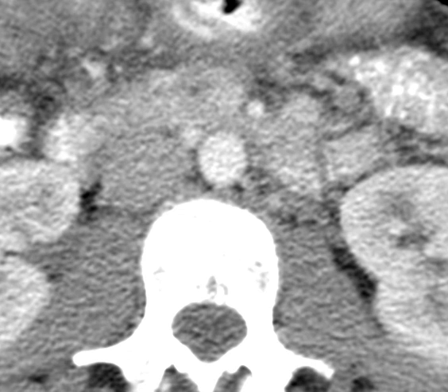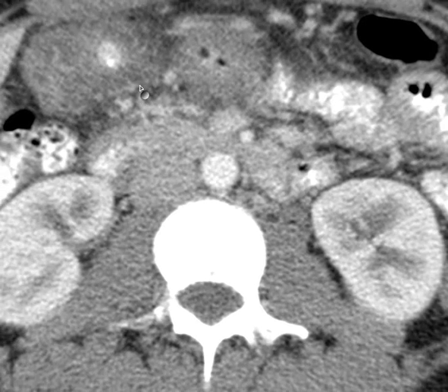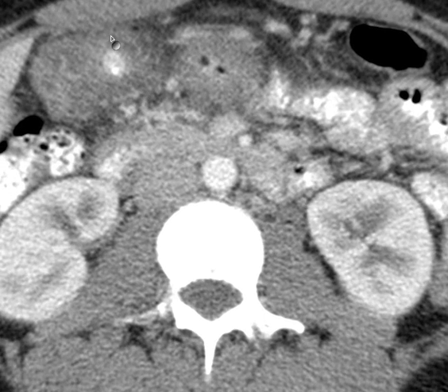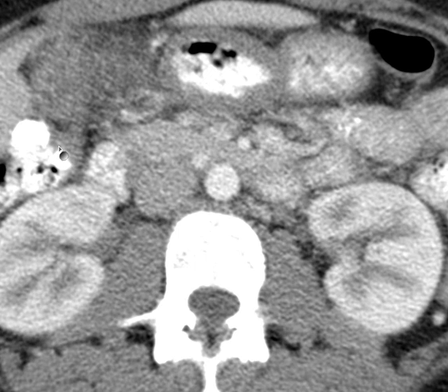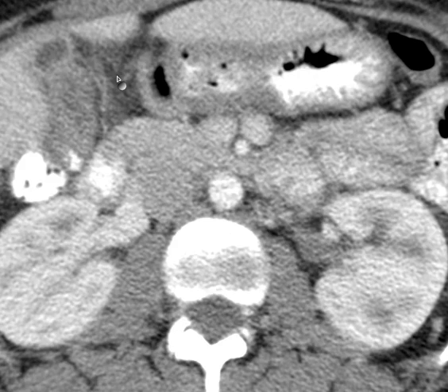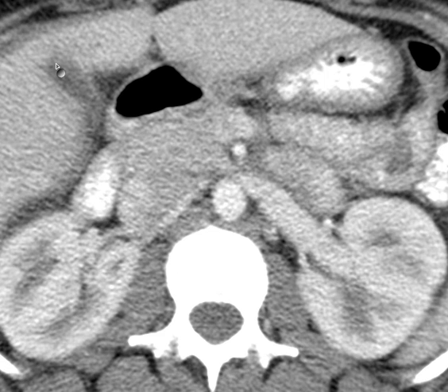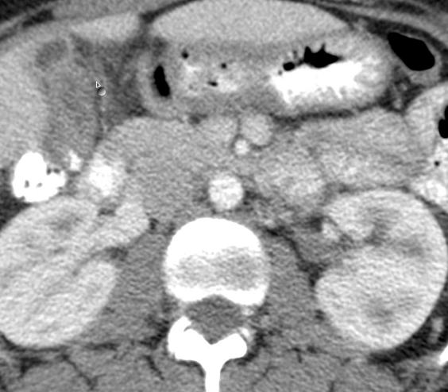Let me see if I can center that. This is a little difficult here. Maybe I made it a little too big. All right, so there. So this is the abnormality, and here is proximal hepatic flexure, and you can see it transition here into this low attenuation structure that actually goes right up to the gallbladder, but the gallbladder is contracted. Here's the gallbladder, so it's just incidentally abutting a portion of the gallbladder.